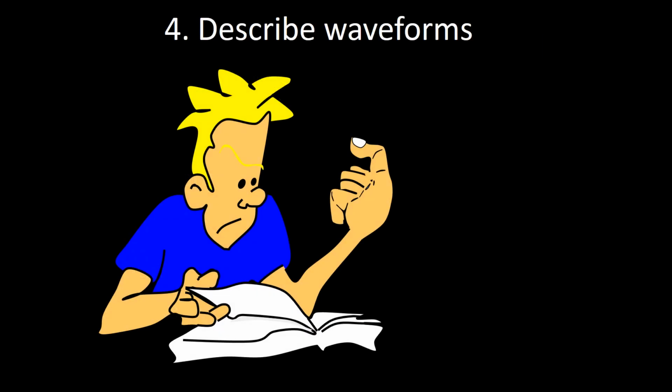First and foremost, it must be reiterated that the description of a wave is totally dependent on the montage being used. Having said that, it is also important to stress that the terminology used is common to all waveforms regardless of the montage that is being used.